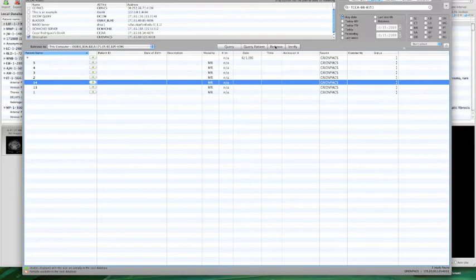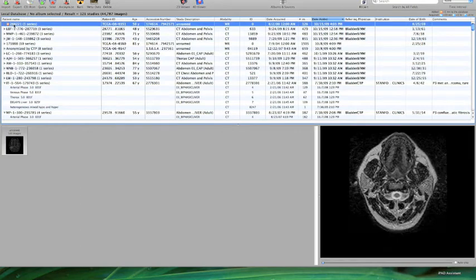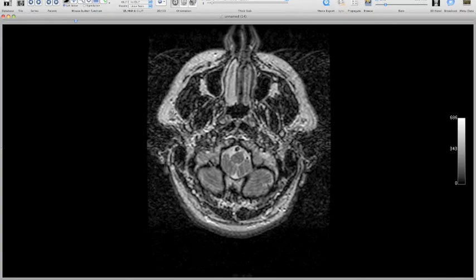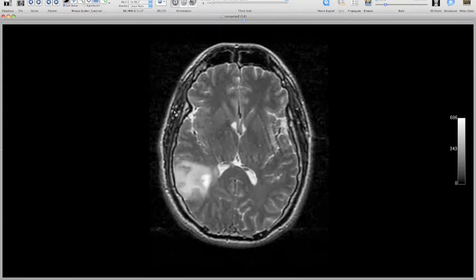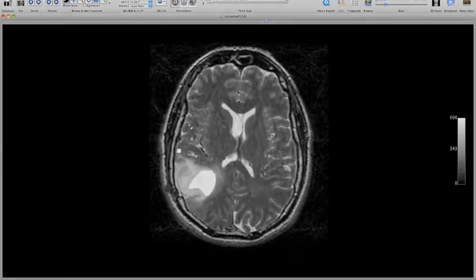And it takes a few moments, but eventually it will show up in my OSIRIX application. You can see the images being downloaded on the lower part of this screen here where the OSIRIX icon is. And now if I close the query window, you can see that it's downloaded that study into my OSIRIX window as a de-identified patient data set. And I'll go ahead and open that up. And so this is a T2 weighted MR series of a patient with a brain tumor, and then we'll move on to showing how to annotate that using iPad.